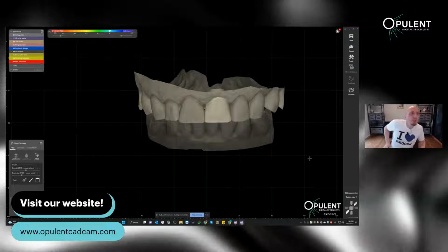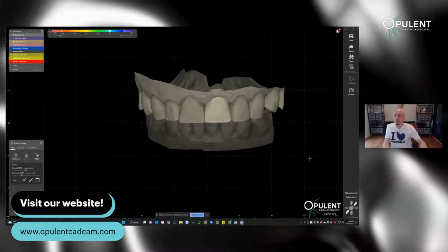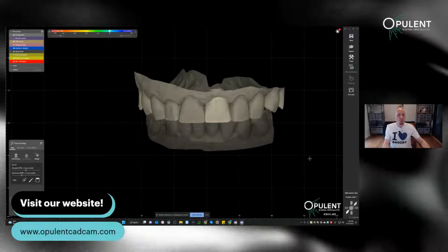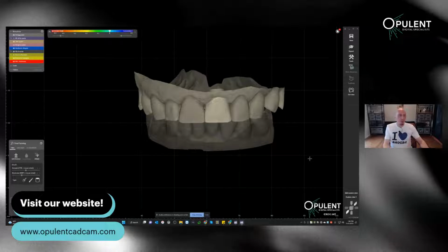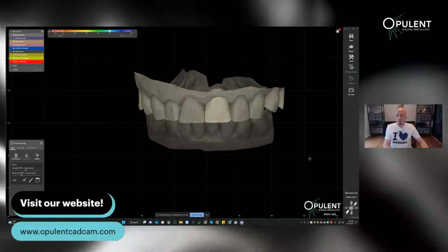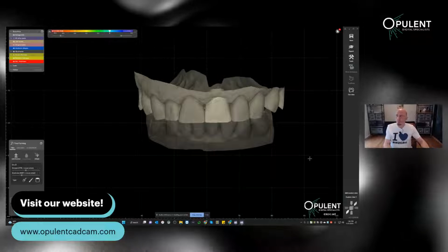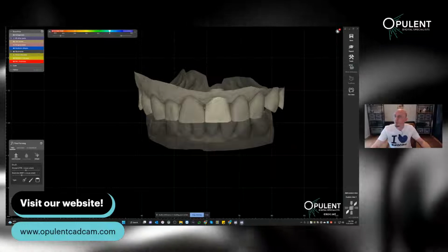What else? We're not looking into full edge cases or anything crazy here today. I just want to give you an overview of what the module does and what kind of options you have with it, maybe make a quick design here, and be here for questions.